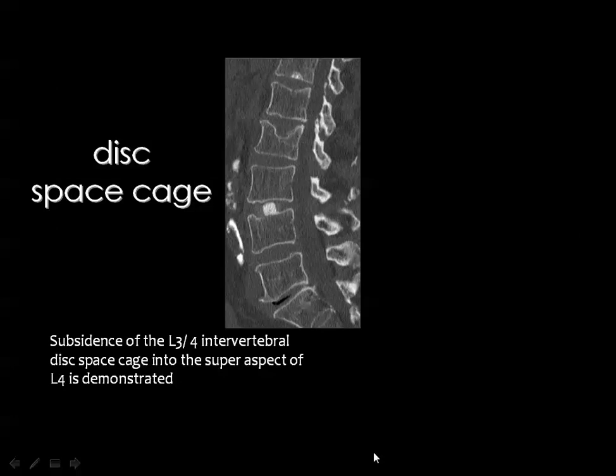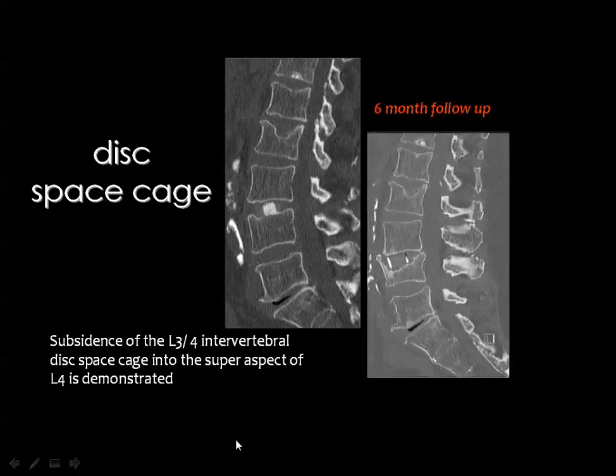Then after removal of the disc, there were many prostheses to be fixed at the site of the removed disc. And over time they discovered too many complications of these prostheses, and they started to change the type and the shape of the prostheses themselves in order to avoid these complications.